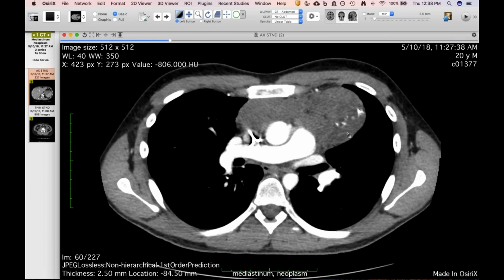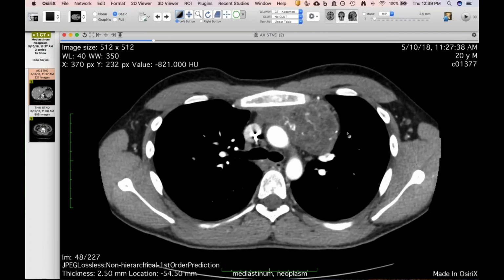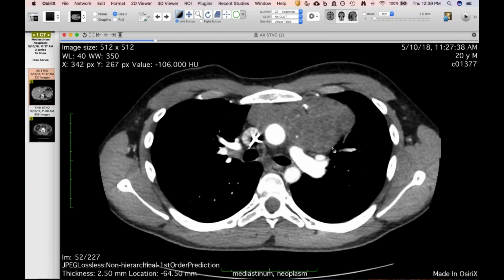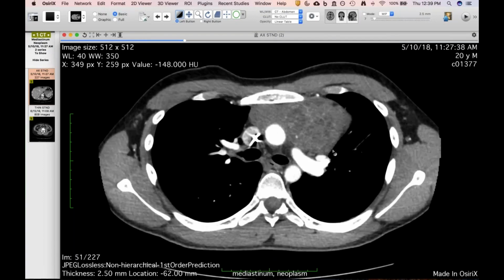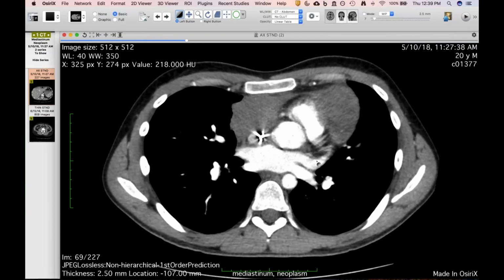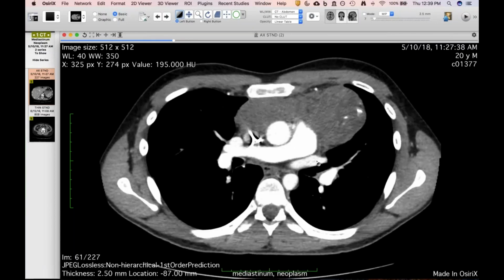Was this a mediastinal primary? It looks like it. Okay. Yeah, I think here you can argue that if he had a testicular primary or something. No, this was primary to the mediastinum. Yeah, as opposed to lung or anything. No, he had no testicular abnormality. So. Okay, well, those are mine for now.